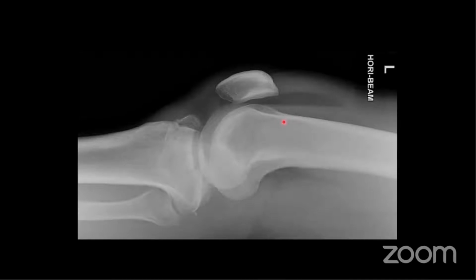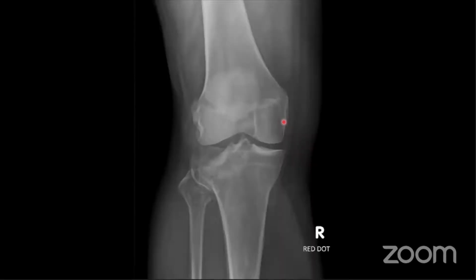Right, okay. If anyone has any questions, then just type them in and I'll keep an eye out. Right, what do you guys think about this one?